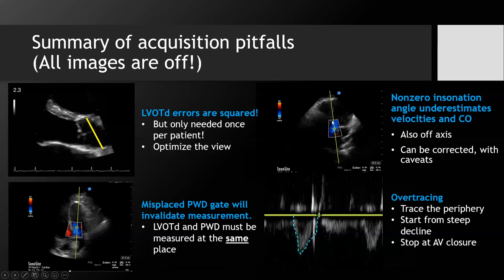I think it's helpful, but it's not necessarily the be all and end all for lining up your probe. To answer your question in general, it's not that the speed is so high that you need to increase your margin, or what's called your Nyquist limit, to identify the right flow. If you're not seeing it on these settings, 99 times out of 100 it's probably because you're just off axis.